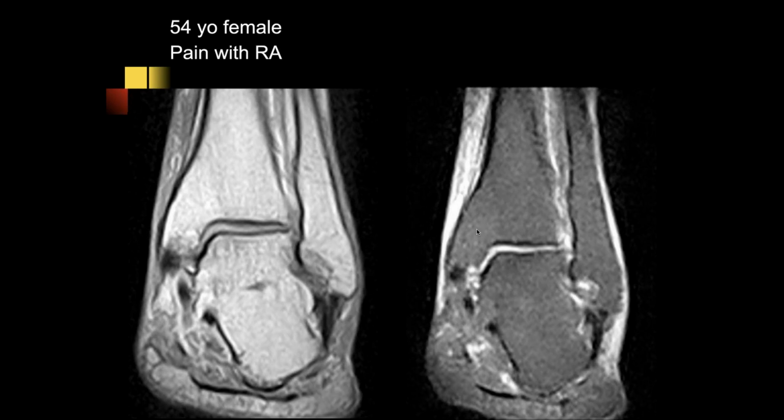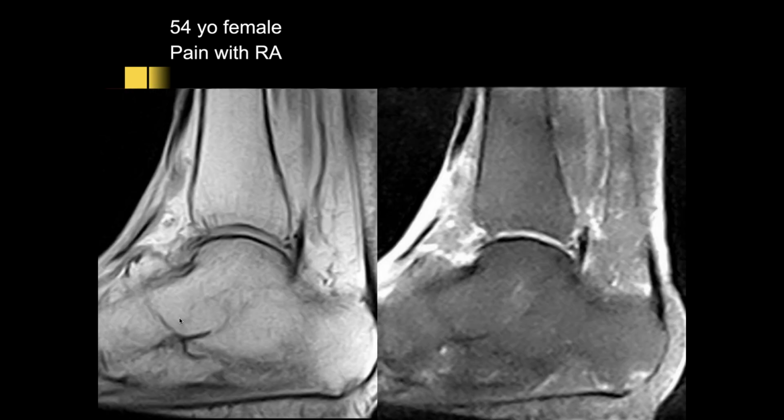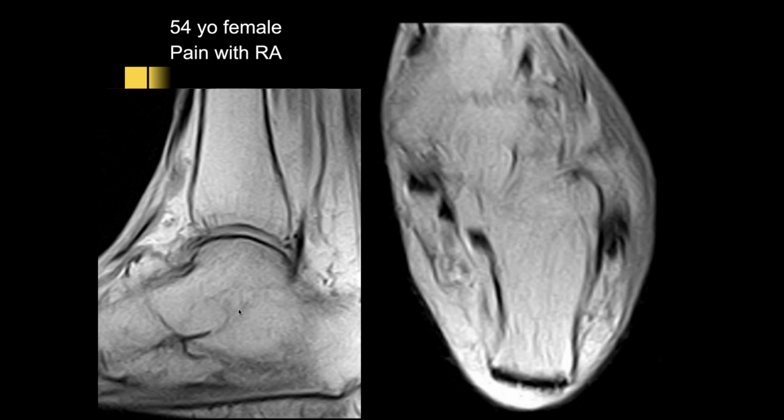Okay, Ashu. Looks like there's another fusion here between the talus and the calcaneus in this 54-year-old female with RA, rheumatoid arthritis. And you can see the fusion better on the sagittal images. There might even be fusion of the talonavicular joint here. There is, yeah. I think I'd prefer these fusions than the severe destructive disease that we saw in some of those others. Yeah, but here, extensive fusion. Self-induced triple arthrodesis. Right, yeah.